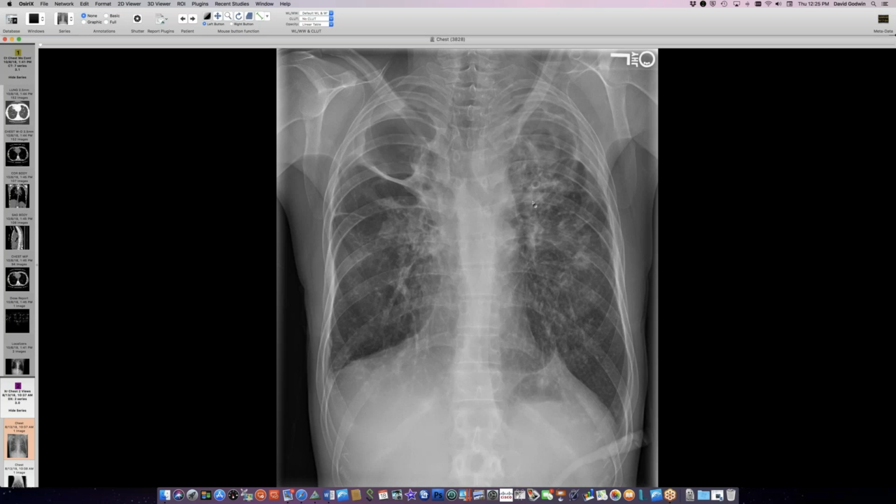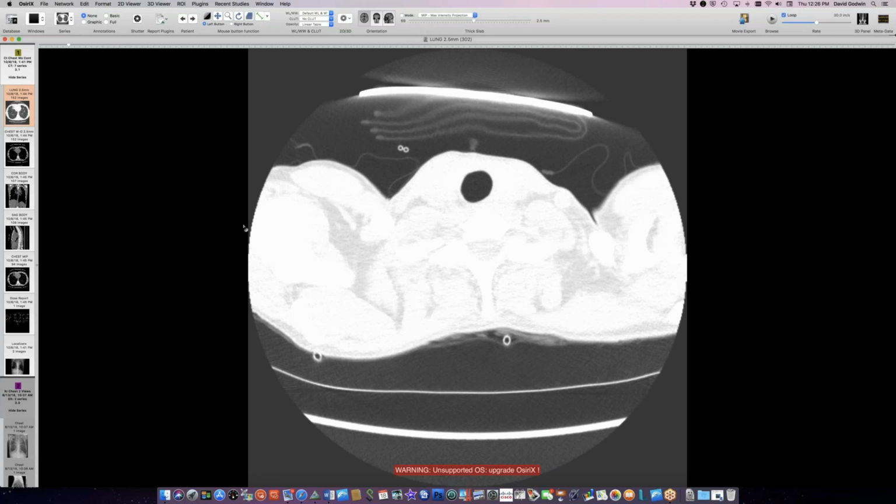But this person developed a serious complication of cystic fibrosis, which is colonization and infection with Mycobacterium abscessus, which is a very aggressive and very hard to treat organism. And that is what has led to these big cavities in the upper lungs. So still there's fairly modest bronchial disease in this person, but a lot of cavitary disease from the abscessus here, which is a horrible infection.